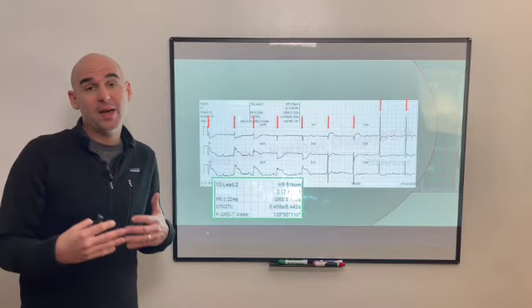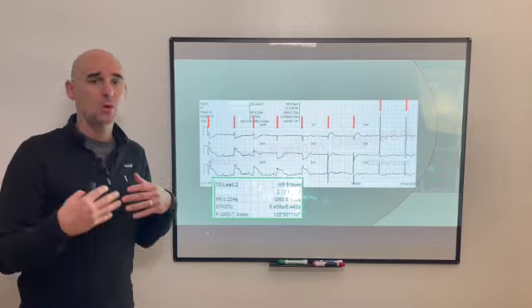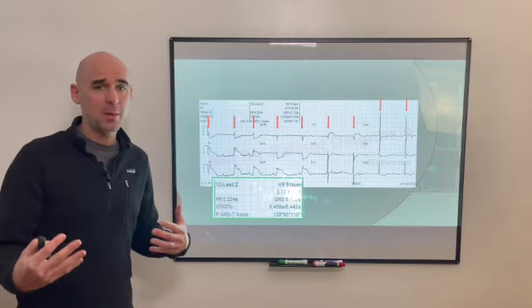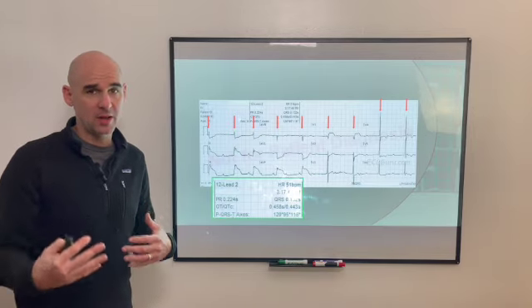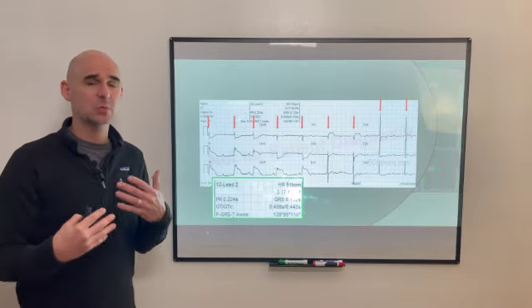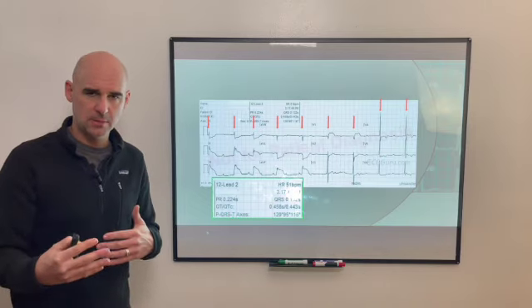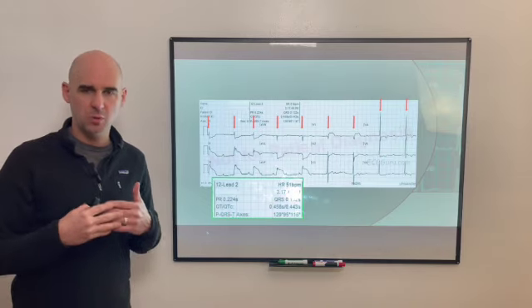No, we've got more than just a STEMI here. We've got a patient whose heart is very sick right now, whose rate potentially is not perfusing the patient well enough, and it could get worse. So we need to be paying attention to that, and that's why it's so important that we do this step-by-step approach to interpreting our 12 lead.